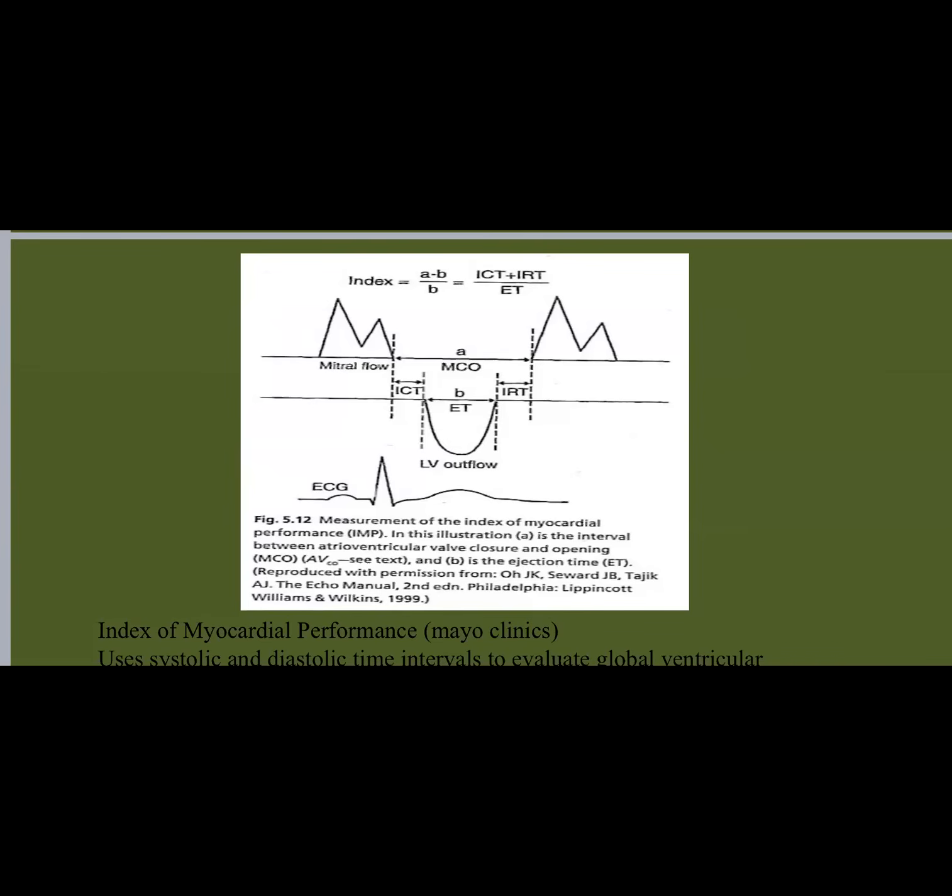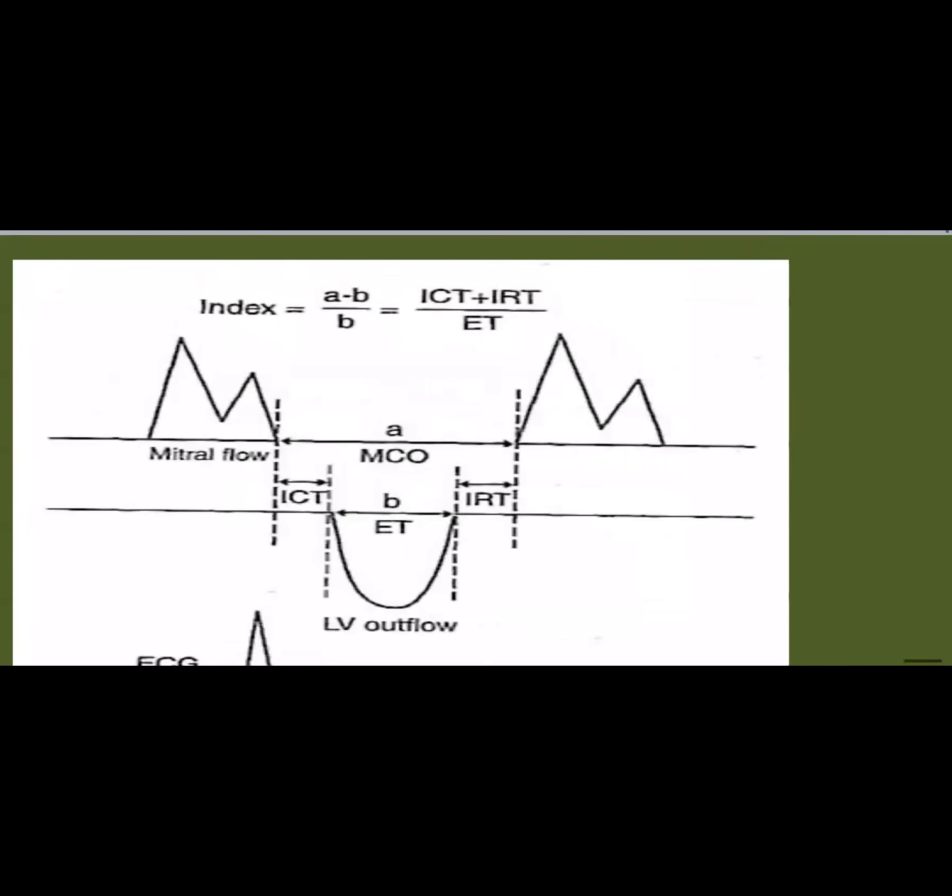The TEI index is the only index in which we include systolic and diastolic function assessment in one figure. So it reflects both systolic and diastolic function in one figure. That's the amazing part of it. How it's calculated, you see here: the mitral inflow, the LV outflow, and the mitral inflow again.